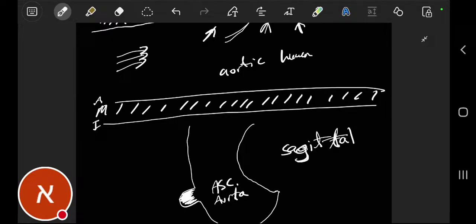You may think it's maybe an ulcerated atherosclerotic plaque, but when it expands beyond the contour of the aortic wall, you need to think about a penetrating atherosclerotic ulcer and not just an ulcerated atherosclerotic plaque.